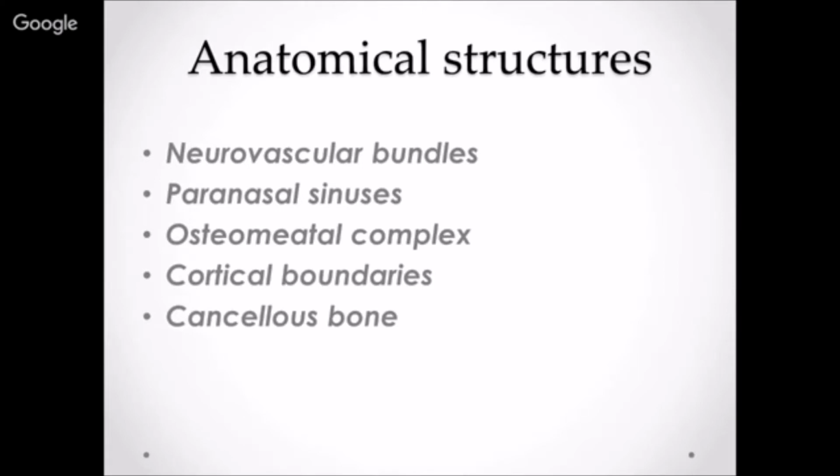The paranasal sinuses. Now, I had mentioned the maxillary sinus. I'm going to take this a little bit further and say paranasal sinuses, because when you do a maxillary scan, there's a very good chance that you get beyond the maxilla and the paranasal sinuses, which is the sphenoid and the ethmoid sinuses, that could get captured within the scan as well. So in matters of sinus evaluations and in terms of actually evaluating the entire image, please be aware, if it's present, you need to be able to look at it and look for any kind of occult pathology that could be possibly hiding.